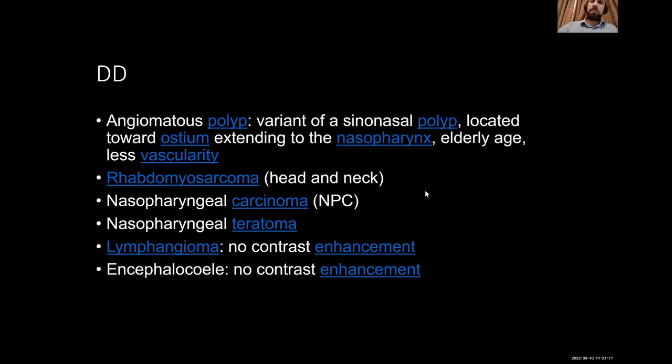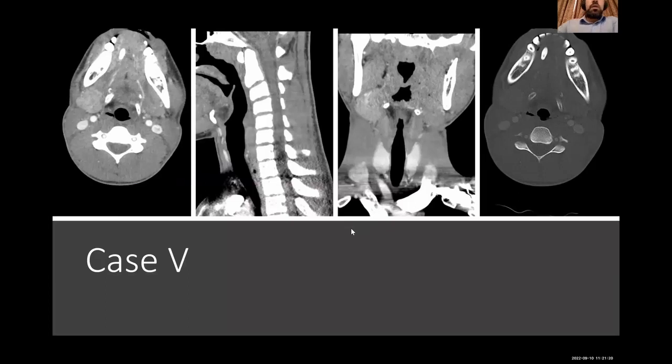Okay, regarding this case, what's your impression? The polyp is a bit of a late presentation. Angiomatous polyp. It is neuroblastoma, very difficult, and the center is not here. Centered around the olfactory nerve, it comes like an hourglass lesion, part intracranial and part extracranial.